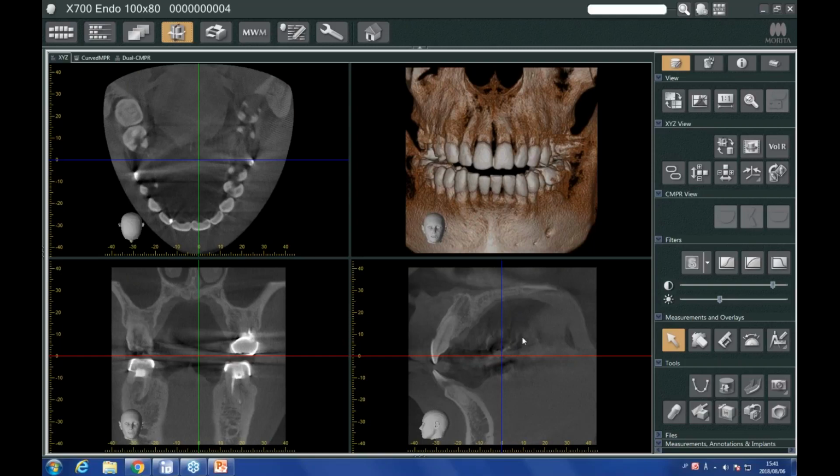Now, I always recommend to our doctors who are using our software to bookmark this data. There's no point to make all these nice adjustments to the contrast and then have to do it each and every time. So of course you can save this at any time during our discussion, and I always recommend to do so immediately after adjusting the contrast.